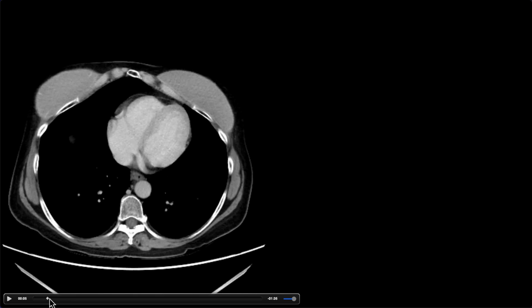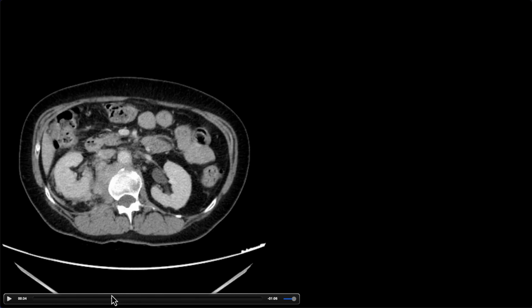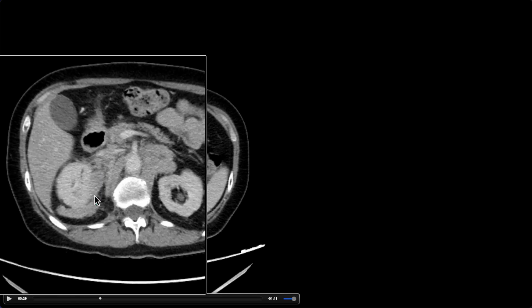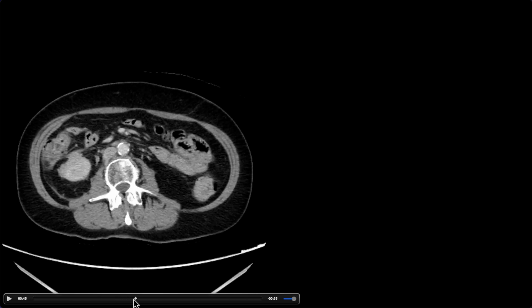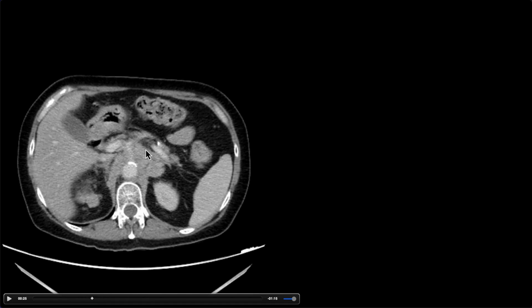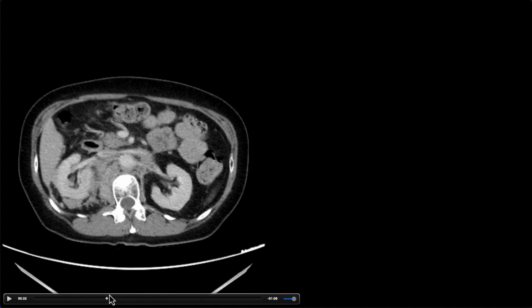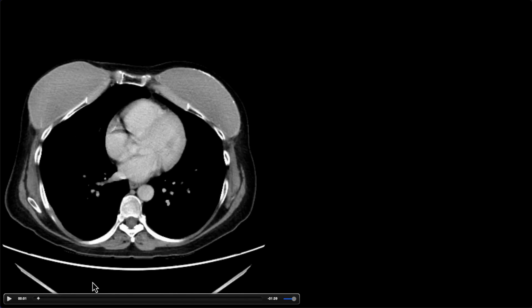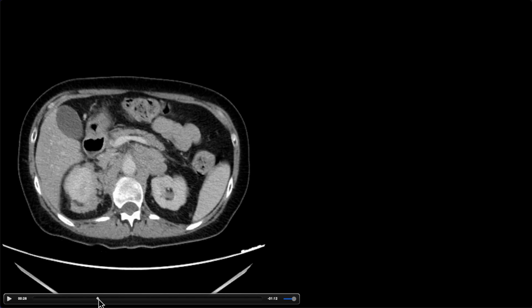This case has some important overlap with the preceding cases of renal lymphoma, but also some important differences. We are seeing a similar pattern of perirenal nodular soft tissue infiltration within the retroperitoneum. There is also some surrounding upper abdominal nodal disease, which is encasing the vasculature. And so certainly at first glance, I think renal lymphoma would be in the differential, but there's another important element of this patient's history, which is that the patient had a history of breast cancer about 7 years prior, and this is just a routine staging examination.